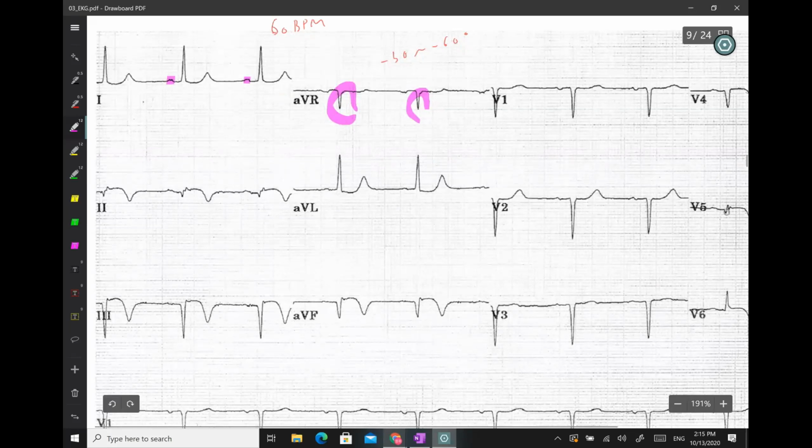Okay, so I thought there are several pathological Q waves around here. I'm not sure about it, but this one. That's a T wave that you marked in green. Okay. Yeah. The QRS complex should be looked at. Lead number 2, you do have pathological Q wave. Lead number 3, you do have pathological Q wave. Not that one, that's a T wave.